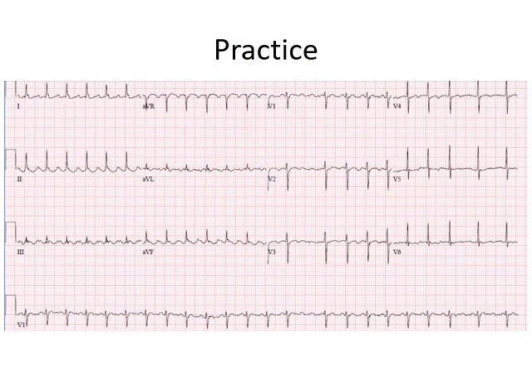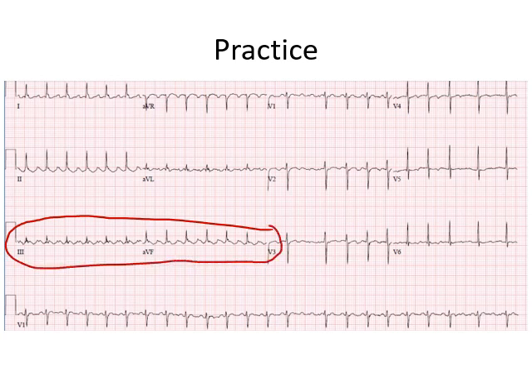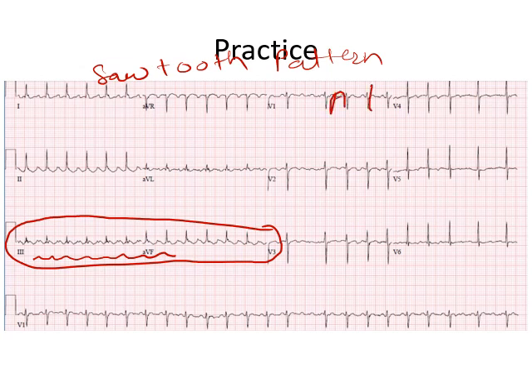This is a very characteristic ECG. I want you guys to focus on these 2 leads. You can see that this looks more like a sawtooth pattern, somewhat like this. Can you guys remind me of a condition in which a sawtooth pattern of P waves is seen? Yes, that's correct. It's atrial flutter. So this is perhaps one of the easiest ECGs to identify. It is atrial flutter.